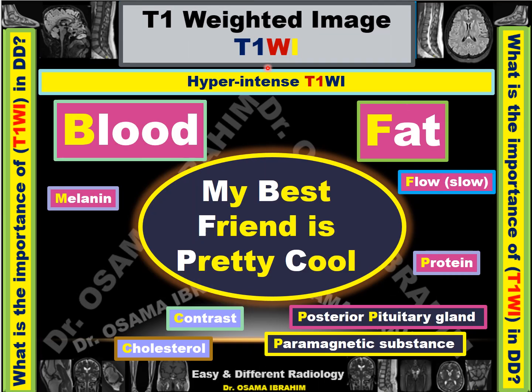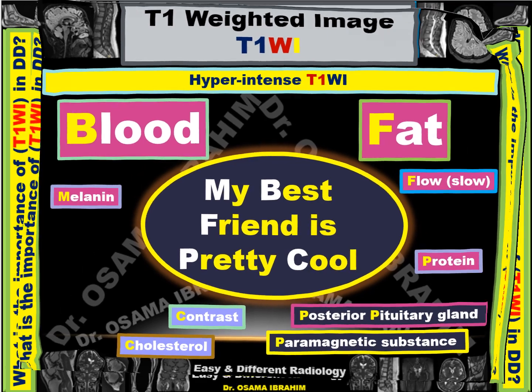Anyway, if I am presented with a hyperintense T1 weighted image, I go to my best friend, "is pretty cool", as a mnemonic word for differential diagnosis, and I check one from these differential diagnoses according to the other MRI sequences and the patient's clinical presentation.